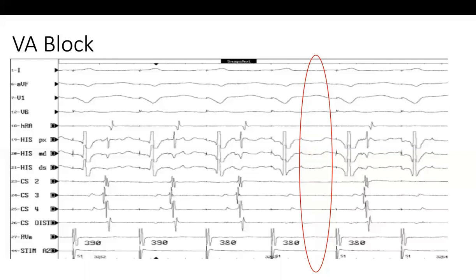Yes. Dr. Ahmed, I think there is a clue also. This is AV. If we see the distal and the left atrium and right atrium, I think the A is almost the same, or it is coming early in the left side. No, the distal is the latest. That means the conduction is probably through the His.